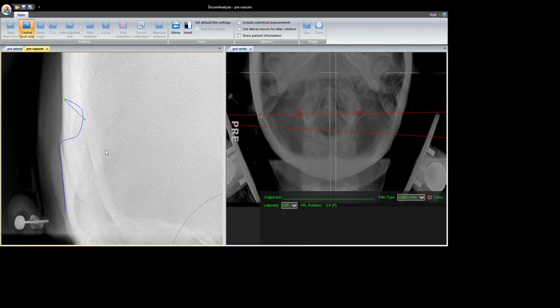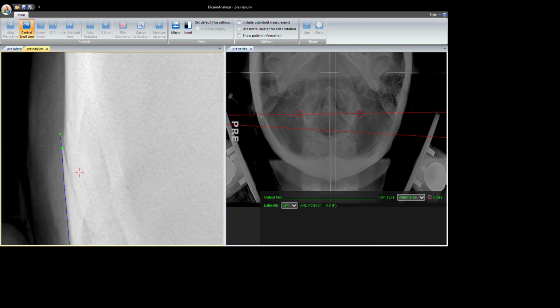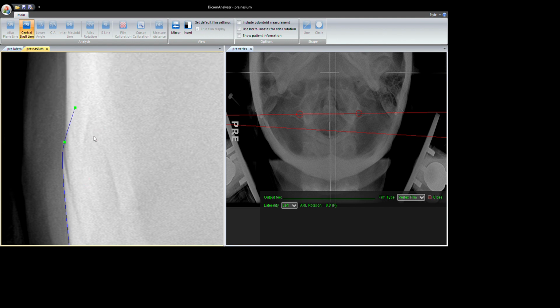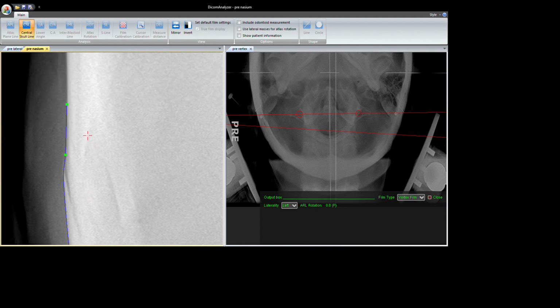Now obviously this isn't the edge of the skull. I've picked some wrong points. So I backspace through and I repick them. Now if you start below your sutures, which you don't have to, normally you're going to be analyzing above the sutures, but in some cases you're going to get a weird skull, and so I always prefer to draw as much of the skull with this as I can, so that if you get one of those strange skulls, you accommodate for it. Now you'll notice I didn't jam all the way back and into that slot. I just kind of try and make that transition as smooth and as close to the edge of the skull as possible.